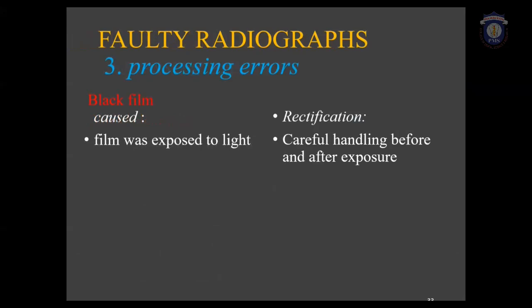A black film. This was caused due to exposure to light. So careful handling before and after exposure can avoid this error.